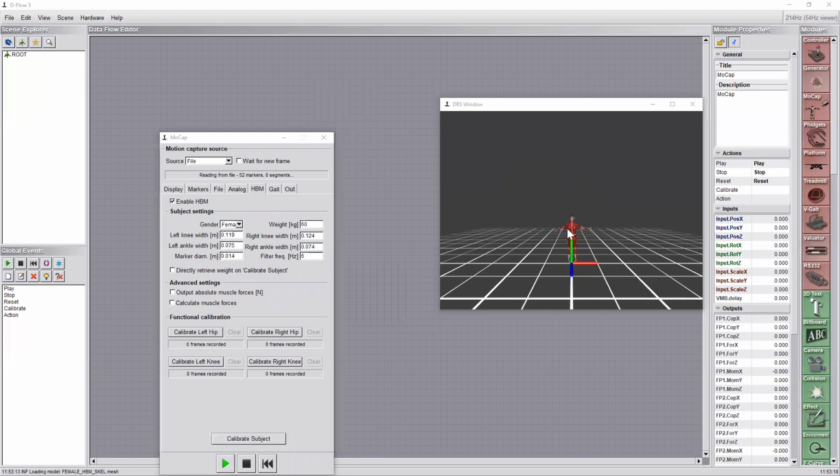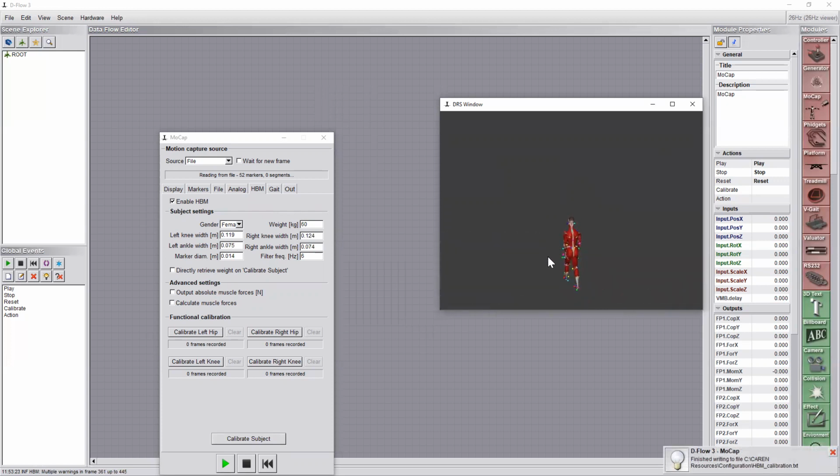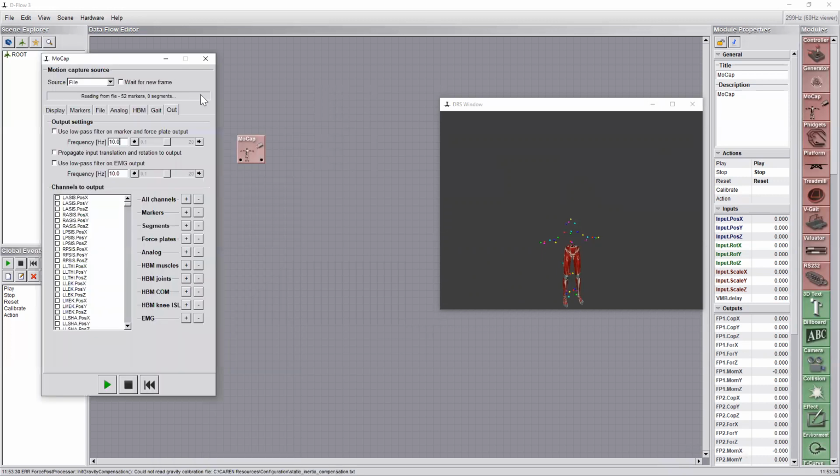So this person walks, as you can see here. I'll just give a bit of, yep. And the reaction force happens. You cannot see it, but it's already there. And if you enable that, the ground reaction force is all present here.